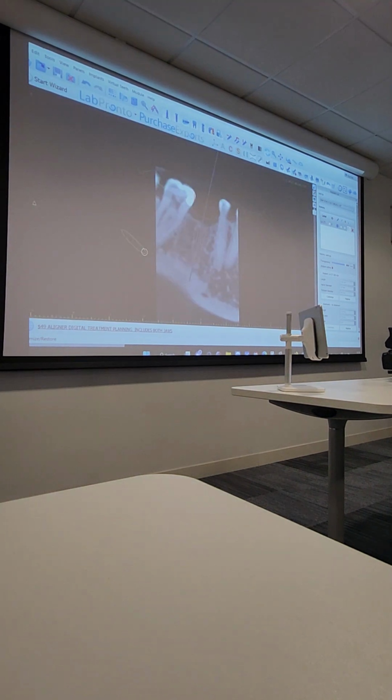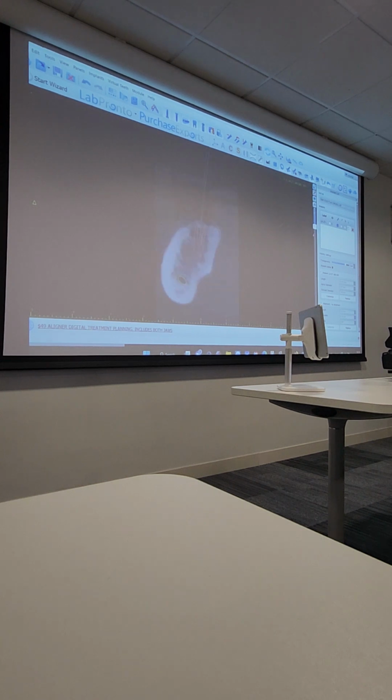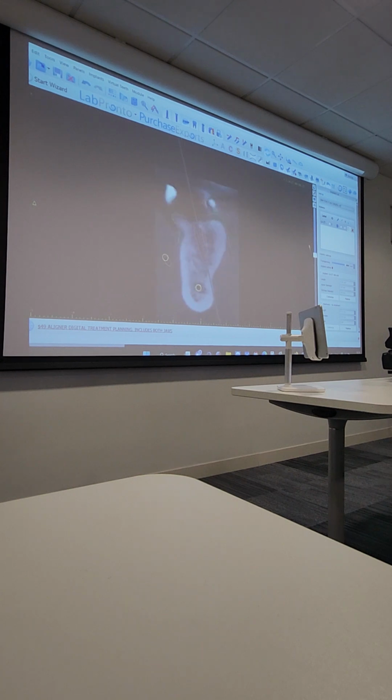Many times I'll just do it for the window. Again, I'll walk through everything. If I want to measure the distance from the tip of my implant to the top of this tissue, 3 mil. That's where I would place my implant, because then I'm going to get 3 mil soft tissue on it, which is the recommended guideline. So again, you're in control of everything. And that's my planning done, guys.